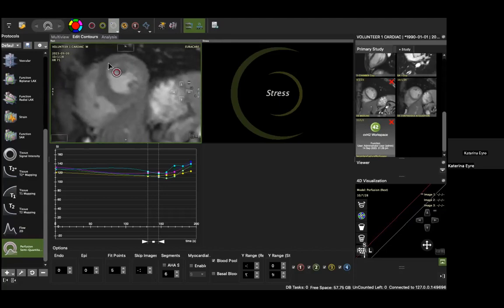I'll just do one more, and then, because I think you guys probably get the point by now, you just keep looking for end systole, keep drawing your contours, be a little conservative with the borders. And then put your insertion points. If you don't put your insertion point, these lines won't be drawn. So your anterior insertion point, inferior insertion point.